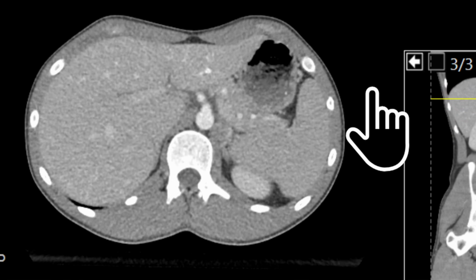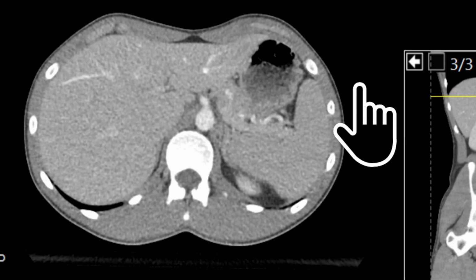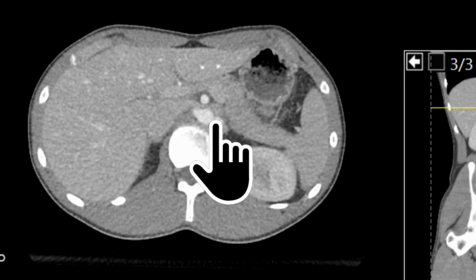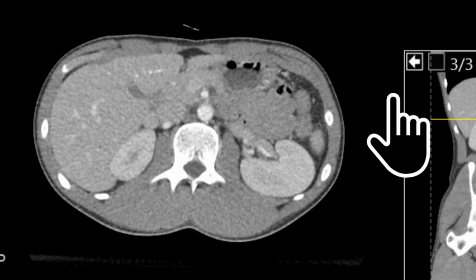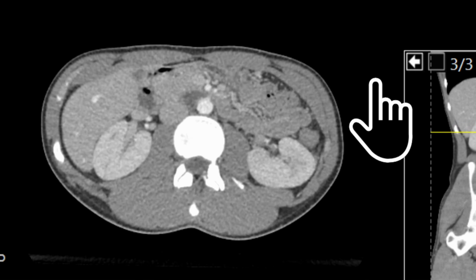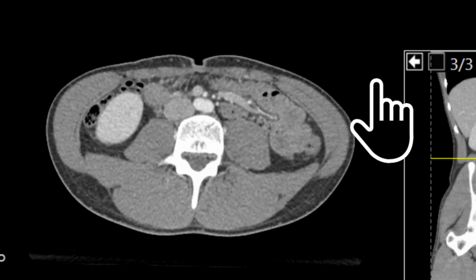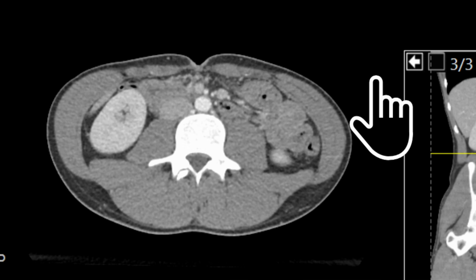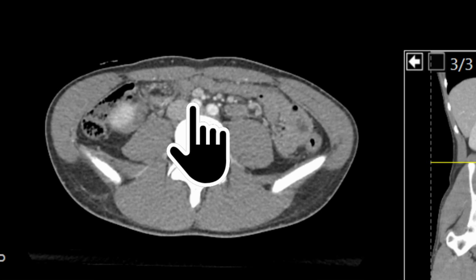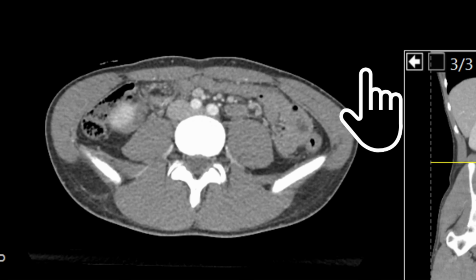Okay, so let's do the obvious one first. So the aorta then, we can see it descends, gives off a branch here, descends, ooh, another branch here, and then that, and that, 2 more branches, diving off somewhere, but we still have our aorta there, our abdominal aorta. As we keep descending though, we can see it giving off a couple of posterior branches, but look, that's the big one. We go from the aorta to 2 blood vessels. So these must be the common iliac arteries, the left and the right common iliac arteries.